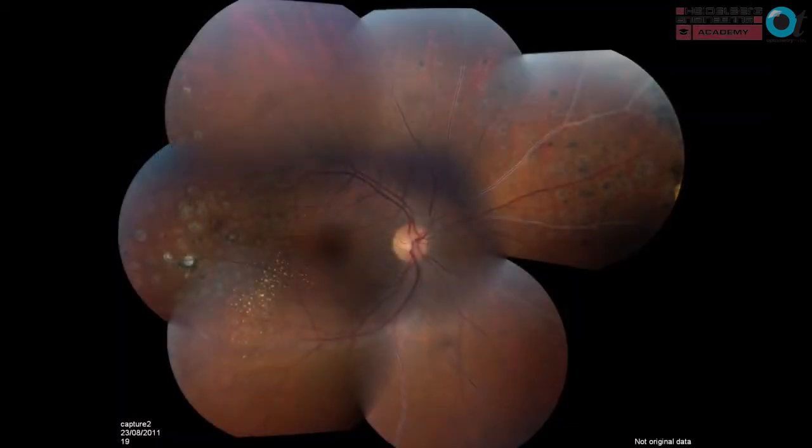That's his OCT showing gross macular edema with elevation of the retina and subretinal fluid. This was him following 2 anti-VEGF injections and laser treatment with fantastic resolution of his exudation and the macular edema, and this patient maintained excellent vision of 6/5, 3 to 4 years following intervention. And this is his OCT 2 to 3 years post-intervention with satisfactory normalization of the foveal anatomy and resolution of the temporal macular thickening.